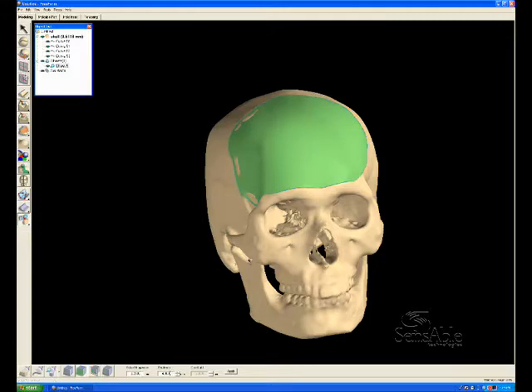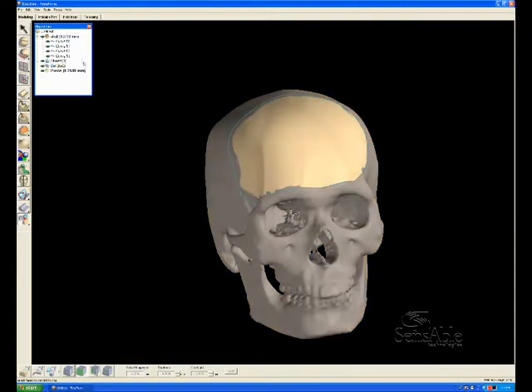We can define the thickness as well as the clay coarseness for this plug. Before we thicken it, the NURB surface has no thickness. It's described only by the boundaries as well as the cross-section curves. We need it to be thickened into virtual clay so that we can tug and push and pull on the patch to make sure that the geometry is perfect with the defect area.